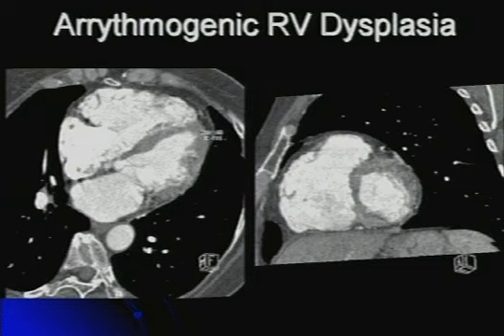This was a patient who was claustrophobic, and there was a question of arrhythmogenic RV dysplasia. Patient was noted to have a dilated RV on echo imaging. We see here that there are large dilated right-sided chambers, and the right ventricular free wall myocardium is very thin and has sort of a scalloped appearance.